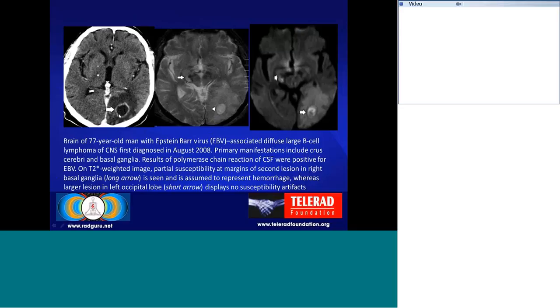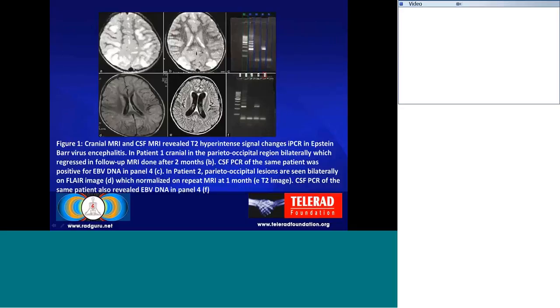You can see a ring enhancing lesion with perifocal edema involving the occipital lobe. On T2 weighted images, we can see a petechial hemorrhage around the lesion, a hemosiderin rim, and in the left occipital lobe there is also involvement. On gradient echo images, we can see nicely that the lesion is involved. The lesion is demonstrating hyperintense signal, and there is also diffuse edema.